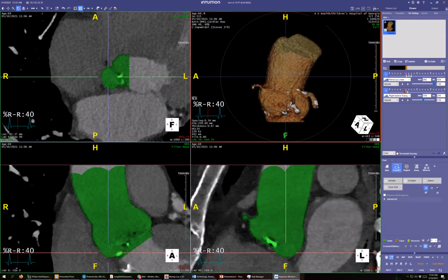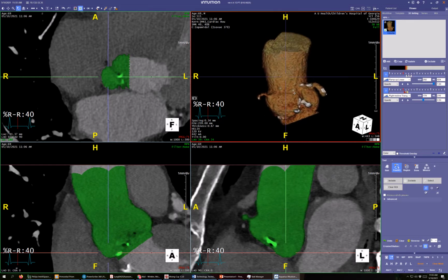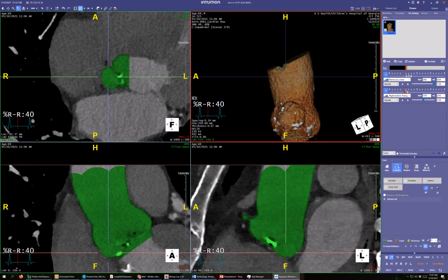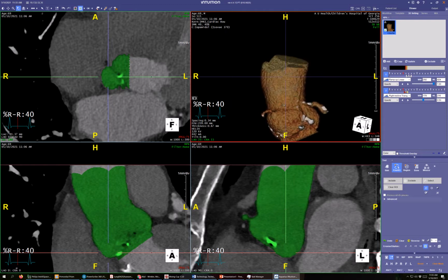We'll come up here. See, when I hover down here near the F, or if you hover at the A, that circle appears. You can just rotate there, and now I'm using the arrow keys to turn it 90 degrees, and I'm just going to shift it back and forth. That would be a nice place to trim.